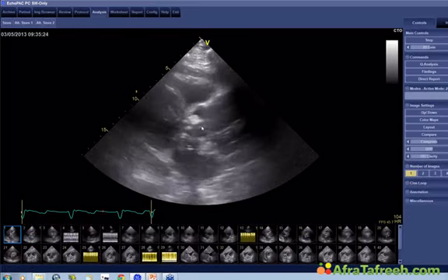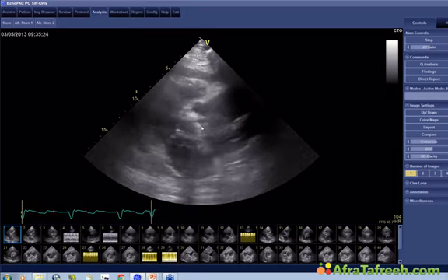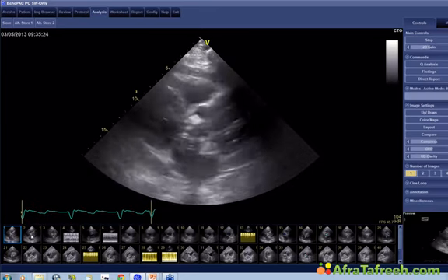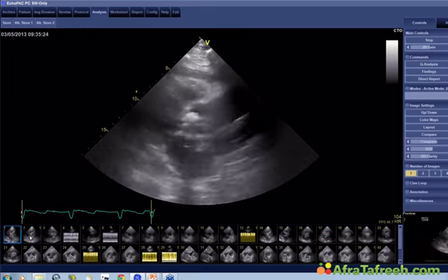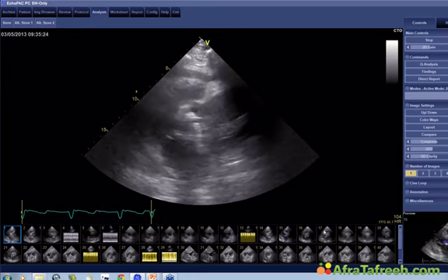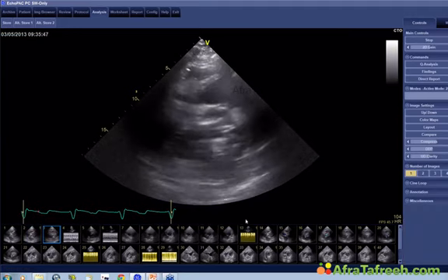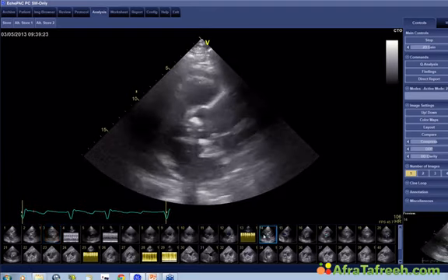Now, if you have a patient coming into an echo lab with fever, the first thing you are considering is myocarditis or endocarditis or pericarditis. This is the question that I have for you. Does the patient have endocarditis or pericarditis or myocarditis? Here is the parasternal long axis view. Here's the short axis view. I'm not going to comment too much on this, but just take a look at the images.